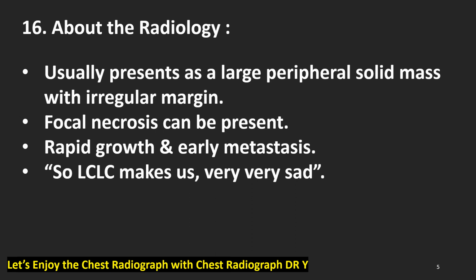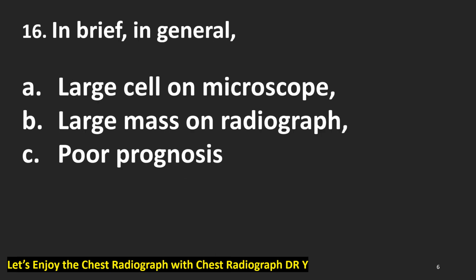So large cell lung cancer makes us very, very sad. That's what Dr. Y says. In brief, in general, the cell is large on microscopy and the mass is usually large on the radiograph, and the prognosis is usually poor.